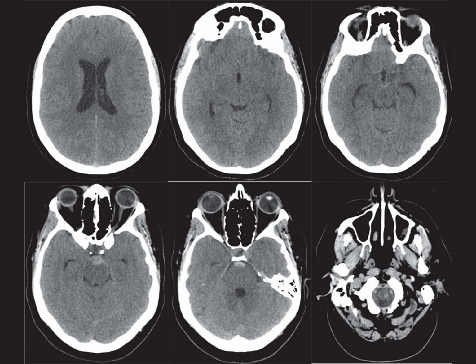In cases where the history suggests a spontaneous bleed, the most common cause is a ruptured aneurysm. Therefore, I would recommend CT angiography to evaluate further. Remember, subarachnoid hemorrhages can be extremely subtle, and even a small amount of equivocal subarachnoid blood on CT should prompt thorough review of all possible areas. In trauma cases, there might be extensive bleeding elsewhere, and with spontaneous hemorrhage, 3/4 of cases are due to aneurysmal bleeds. Therefore, CT angiography is essential for identifying the source.